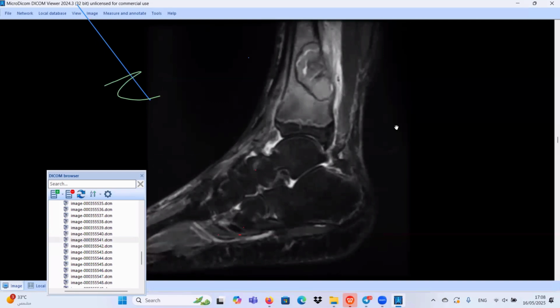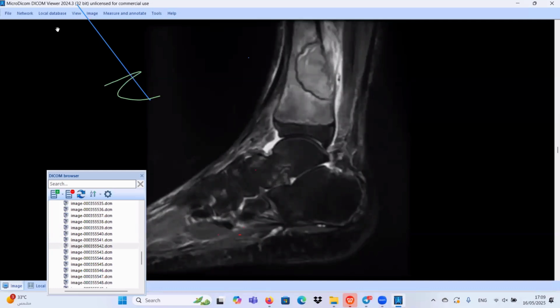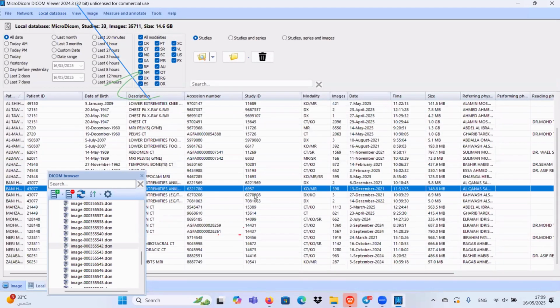Yes, as you said, and because of the time, I'm sorry. In this case, as you said perfectly, the first diagnosis is non-ossifying fibroma. We don't have any fluid levels, so aneurysmal cyst is not logical in this case. We don't have any extraosseous soft tissue component, but we have soft tissue edema, and this can be explained by the pathological fracture across the region. Really, we diagnose this case as non-ossifying fibroma.